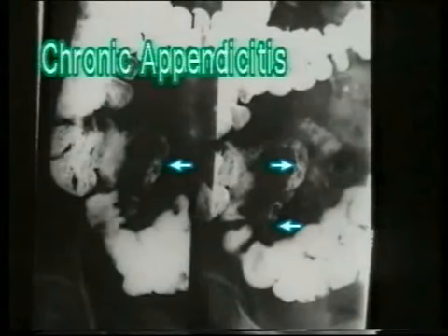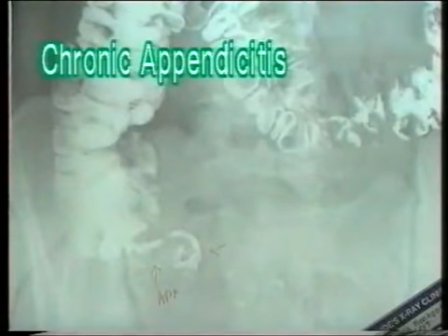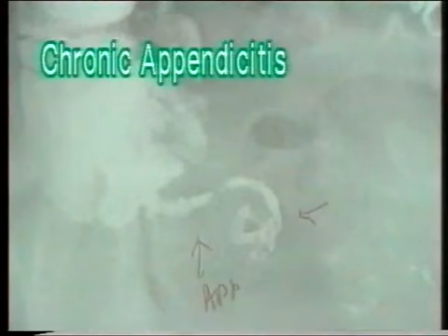This appendix shows multiple filling defects due to fecoliths. Presence of fecoliths is also considered very suggestive of appendicular pathology. Note the multiple filling defects, though there is no narrowing of the lumen. This is another appendix showing an acute curvature suggesting adhesions and an irregular lumen suggesting mucosal inflammation. This is an appearance of chronic appendicitis.